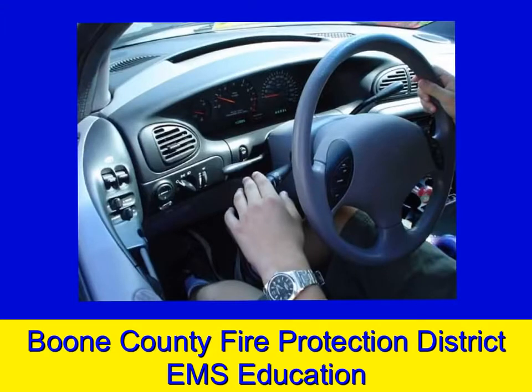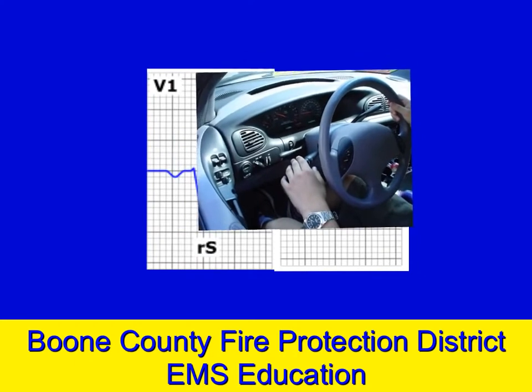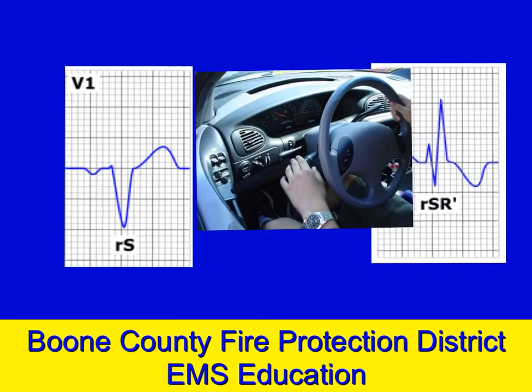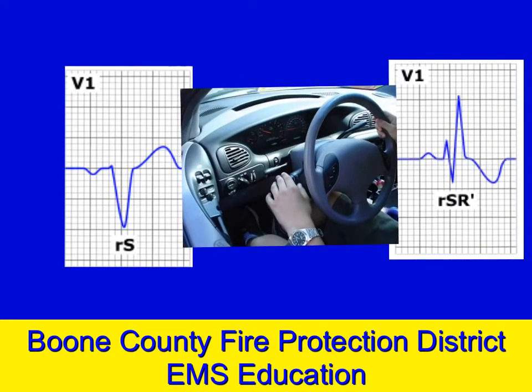The metaphor here is the turn signal in your car. You pull down to signal left, you pull up to signal right. So I'm going to move our turn signal out of the way and move a couple of complexes into view here. A key point is that you must be in lead V1. If you're not in V1, this does not work for you.